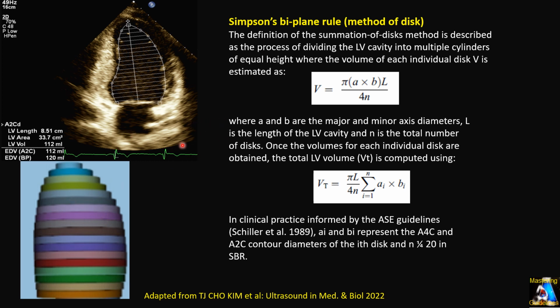That is our assumption: first of all, that the left ventricle is almost bullet shaped, and that the base of the left ventricle, which is the mitral annulus, is perpendicular to the left ventricle length, as you can see here. These are two assumptions that in some cases bring some error, which I am going to explain later.